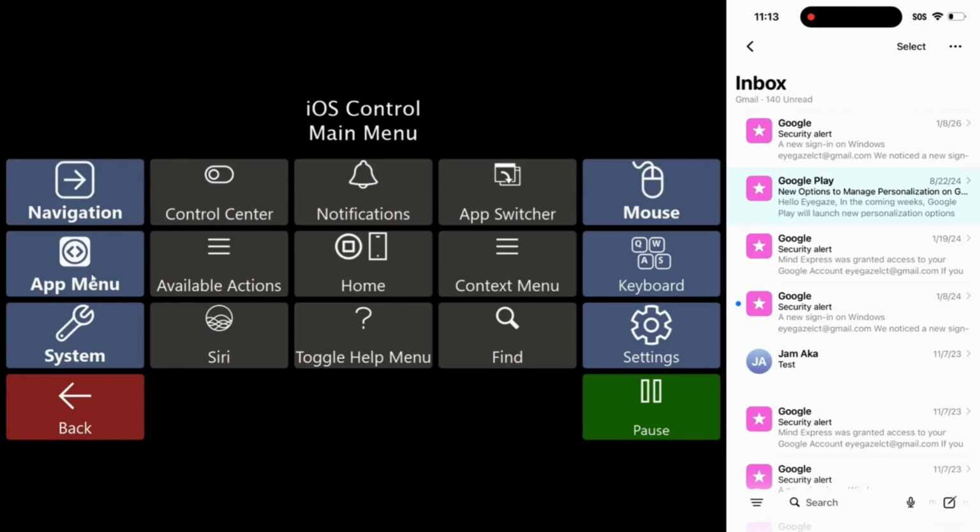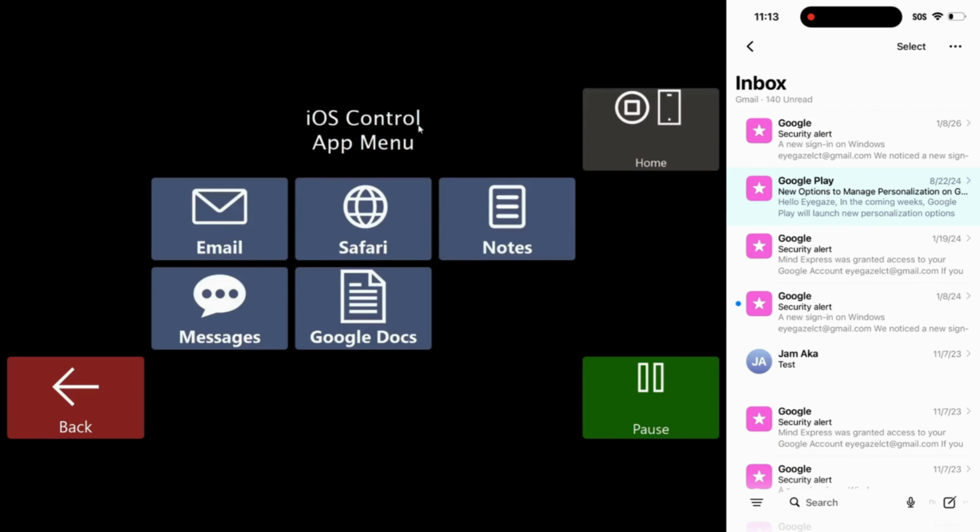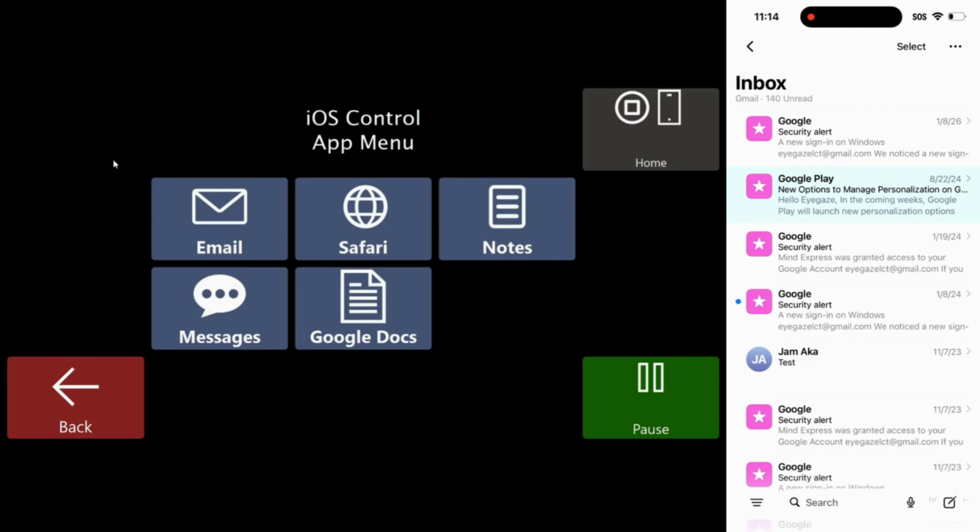Looking for an easy way to read emails or send a text message? The App menu page includes a list of commonly used apps we've pre-configured with helpful keyboard shortcuts to make using them simple and hassle-free. Keep in mind that for any of the buttons we provided, you may get different results depending on what device model you have or version of iOS you are running. If any of the provided shortcuts are different, you can manually enter the shortcuts using the keyboard.